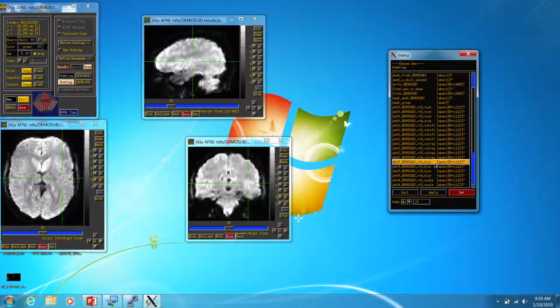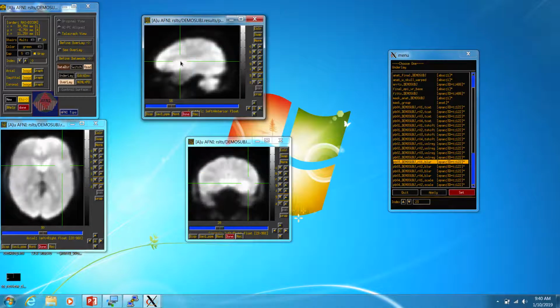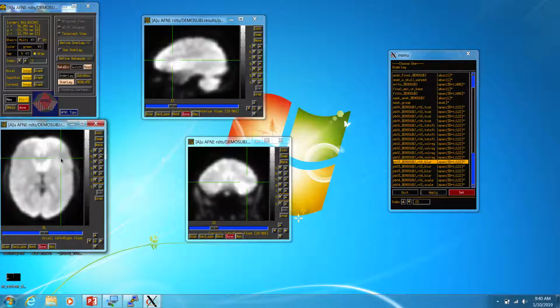Then our next and also very important step is our blur step. So this blur step helps reduce noise. It also reduces the specificity of the signal as well. So you'll notice a pretty big shift here, and you didn't forget to put on your glasses. This is basically what happens. So you can see really clearly visually here that when we're talking about this voxel that we're looking at, it's a little more ambiguous, like where that exact point is.